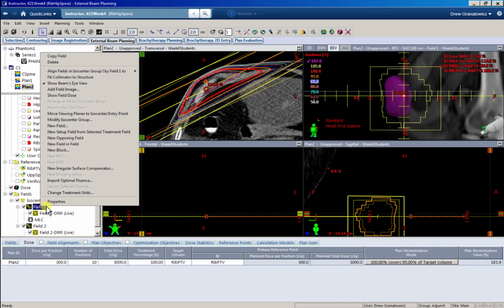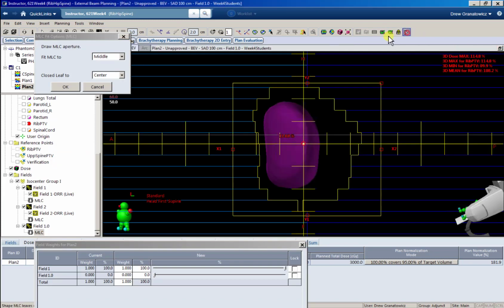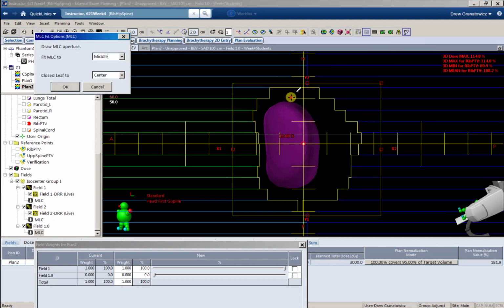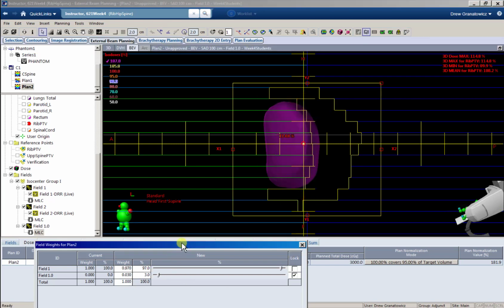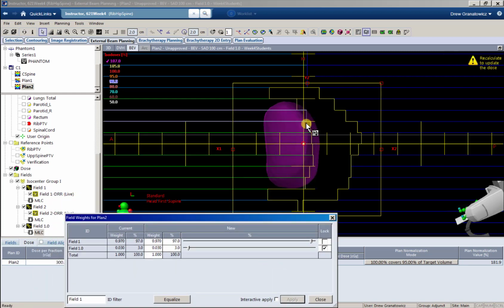Okay, let's add a couple field and fields. And again, you can kind of see, you get that 3D view of this isodose cloud, right? So the edge closest to us, you can kind of follow that line right here. The far edge you can follow here.